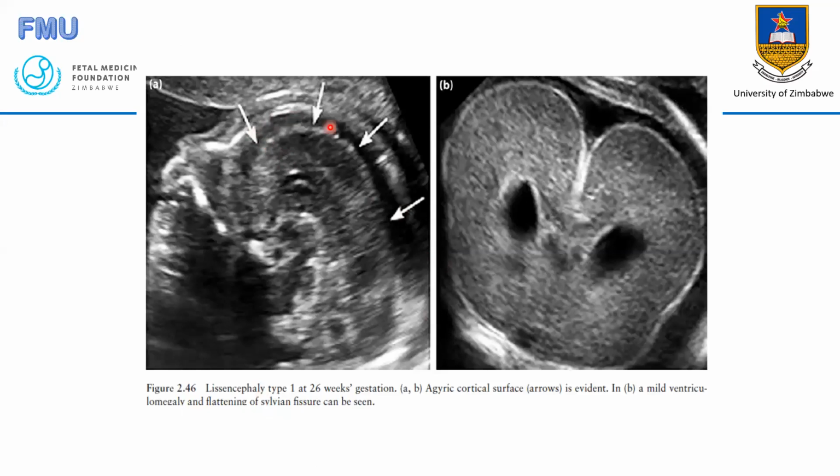And when you look at the sagittal plane, it will look like the skull is too large for the brain. You are going to see this large fluid space around the brain here, and a very smooth brain surface. This is the coronal plane, and this is the sagittal plane. You should not see fluid. You guys have been doing this plane.